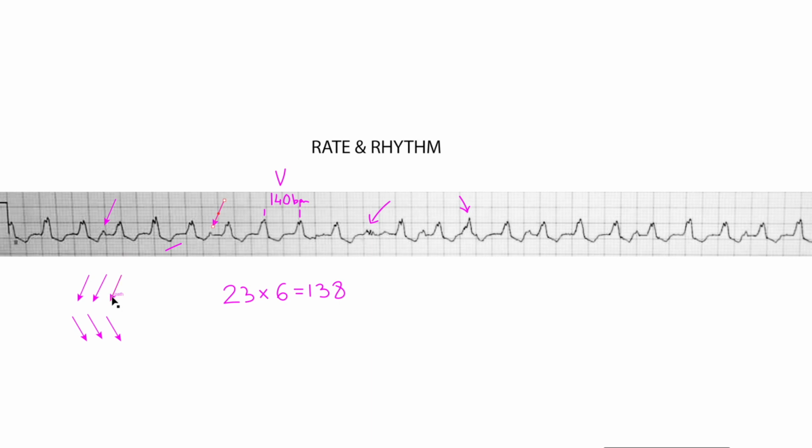I don't know if you can pick that out, but I'm just going through the ECG here and seeing where I can find these little blips. There could be more. I'm just throwing darts, arrows onto what stands out to me. So right now I don't know what I'm dealing with, so I'm just trying to get as much information as I can before I start making any sort of assumptions or conclusions.